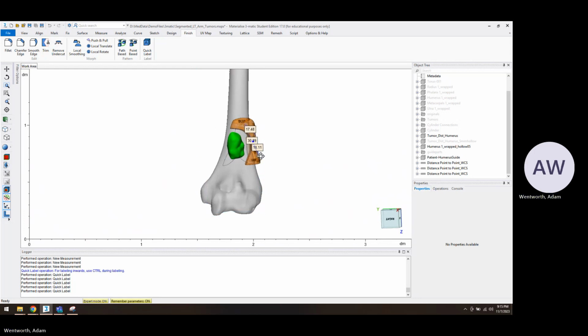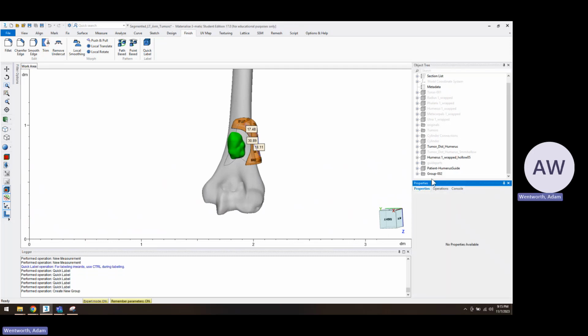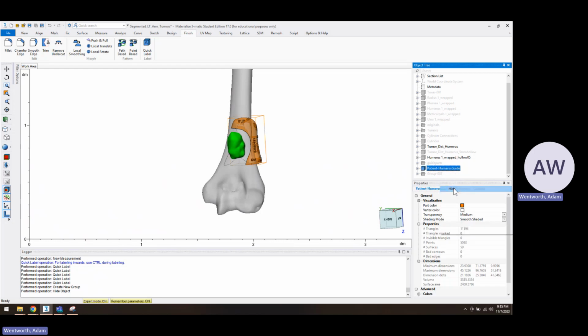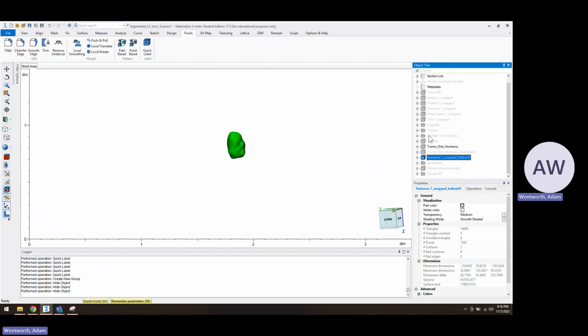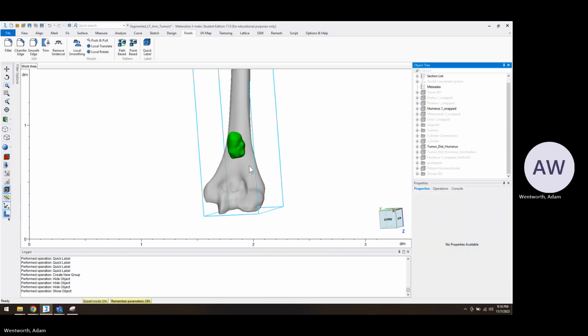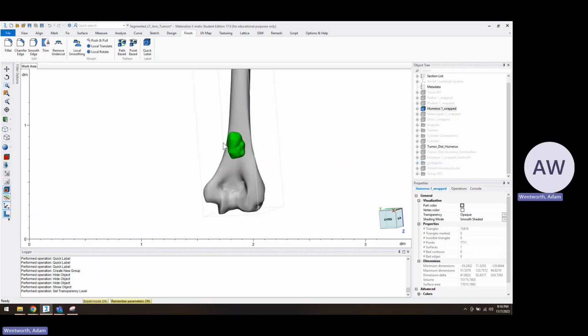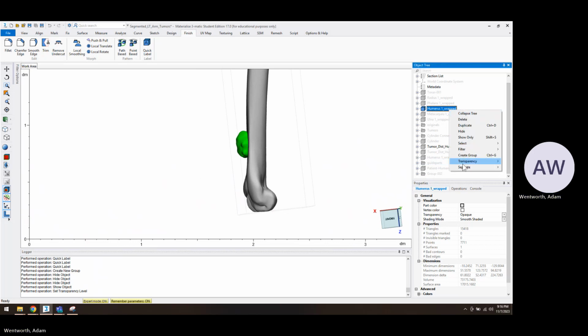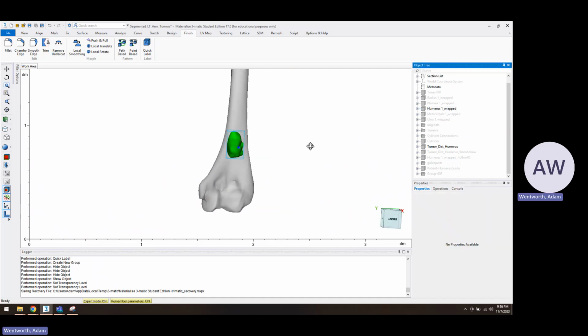After all of this, I'm going to produce a summary of all of this for the surgeon, which will help guide them how to use it. So you likely will start with screenshots. You can hide this hollowed humerus and just use the original. We do screenshots. You might do opaque and transparent from a couple different angles, which help them see the depth of the tumor at different perspectives.